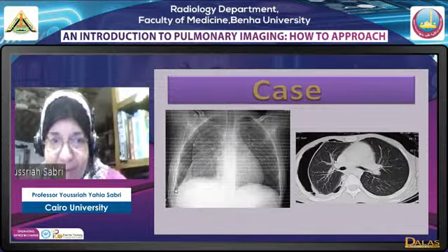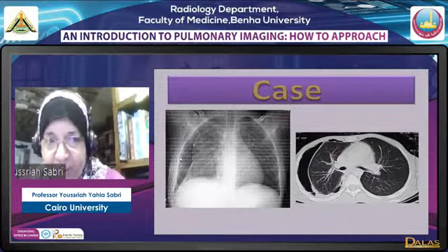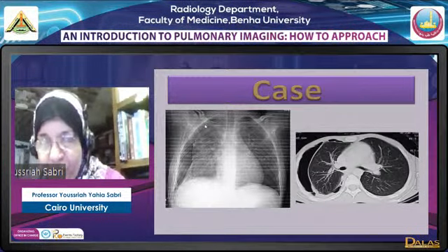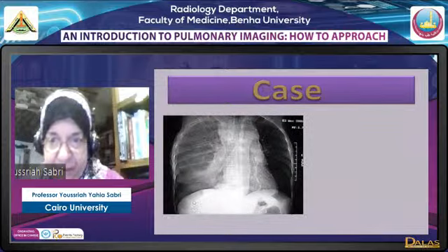Pneumothorax should have a deep sulcus sign. This is jet black, so this is air. Air should not be seen laterally. If there is air, it should be normally medially and inferiorly, not laterally and superiorly. If we see air in an abnormal position, even from this scanogram, it suggests loculation. It's not free to go.